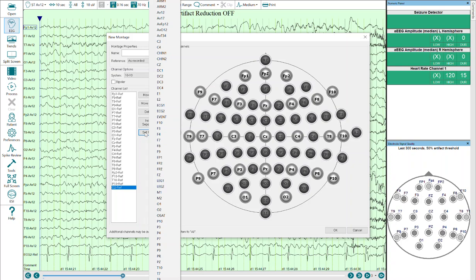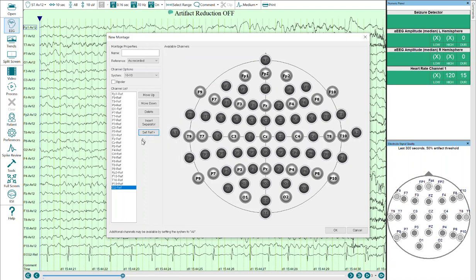And the reason is some earlier versions of software wouldn't allow you to set the reference from here. Later ones do allow it. So we're just going to skip that. And personally, I like to do this in the montage itself. So I'm going to give this a name. I'm going to call this STAVG all. I'm going to average all my scalp channels for that. So for that, I want to go to the average montage editor. But I'm going to go ahead and save this.